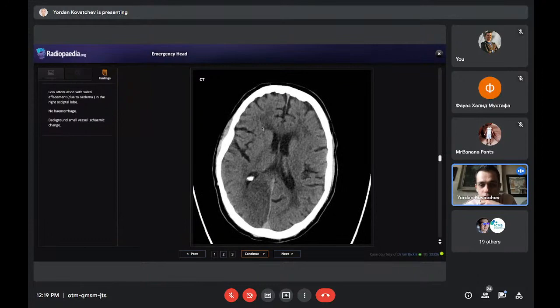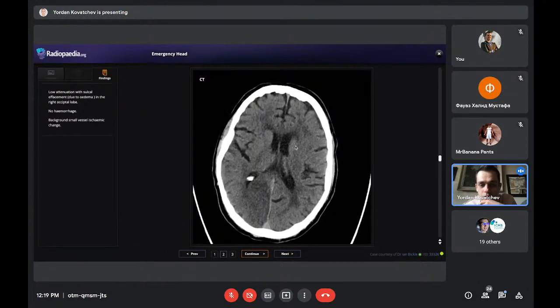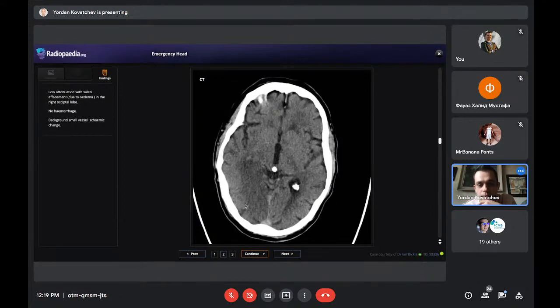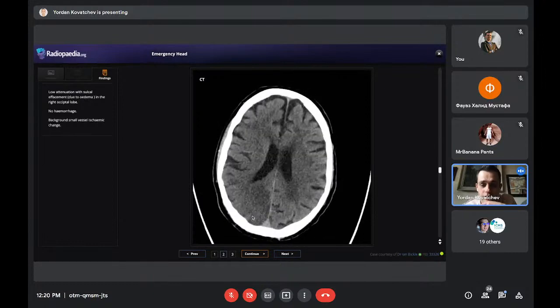Basically fine. When we scroll a little bit and look around, we see the head of the caudate nuclei are fine, and the lentiform nucleus and the thalamus on each side. Really, the problem is paramedian, next to the central line. In the occipital lobe, there is cytotoxic edema.